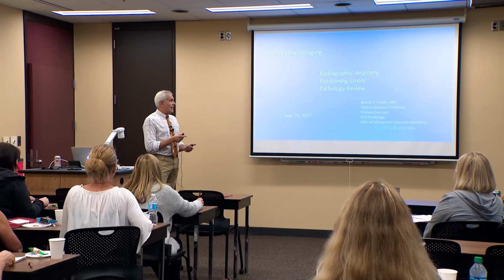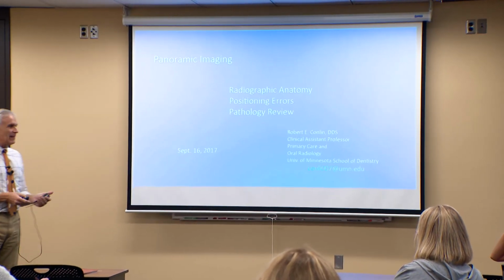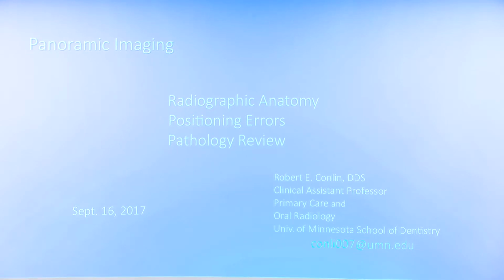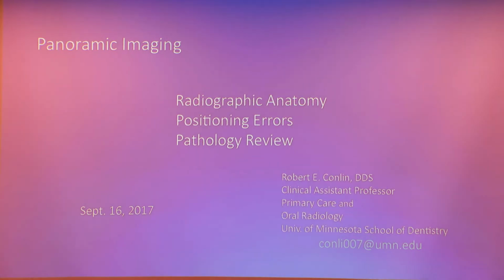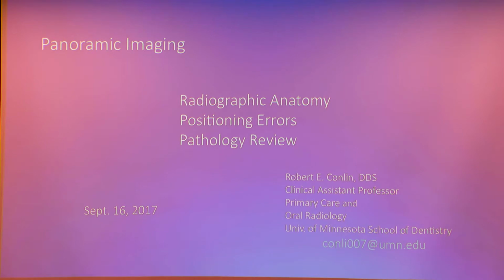Of panoramic anatomy, that will be new. Okay, the positioning errors will be somewhat of repetition, but with some different cases. And then mainly for your reference, I put in some slides about a pathology review. I'll just cover the basics of how we look at images and try to decide what's normal and what's not.